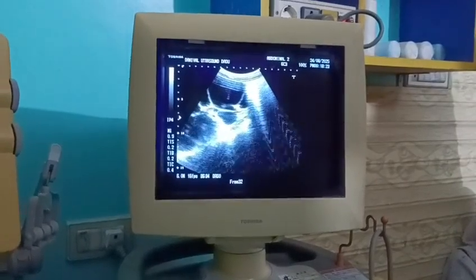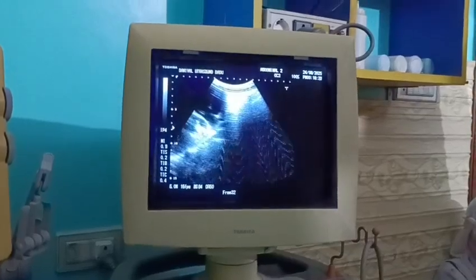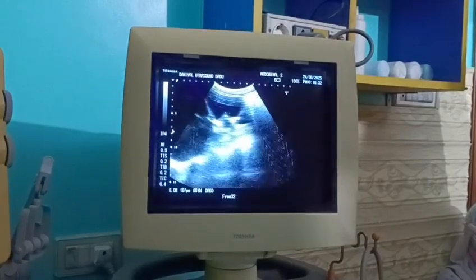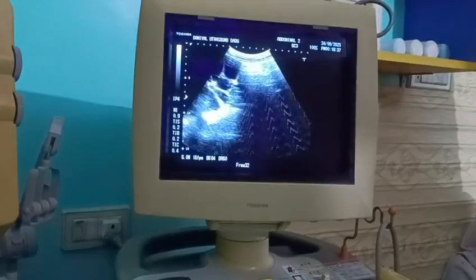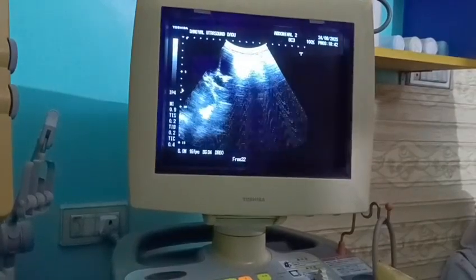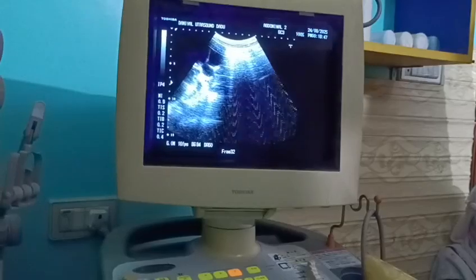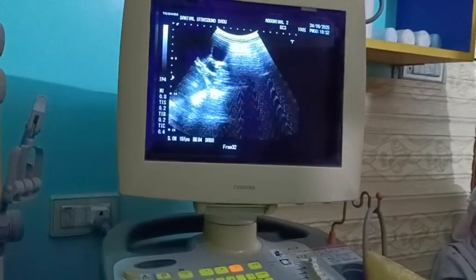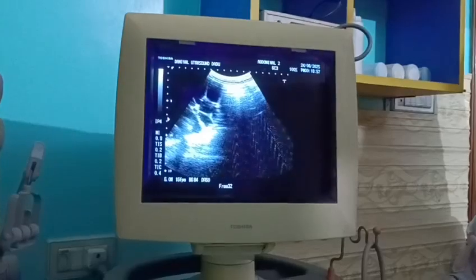The second point is the shape. Cysts are typically round or oval and well circumscribed. They are spherical, anechoic lesions with smooth walls. The calyces, however, are usually irregular and branching, and they look like cauliflower-like anechoic structures. So this is important.